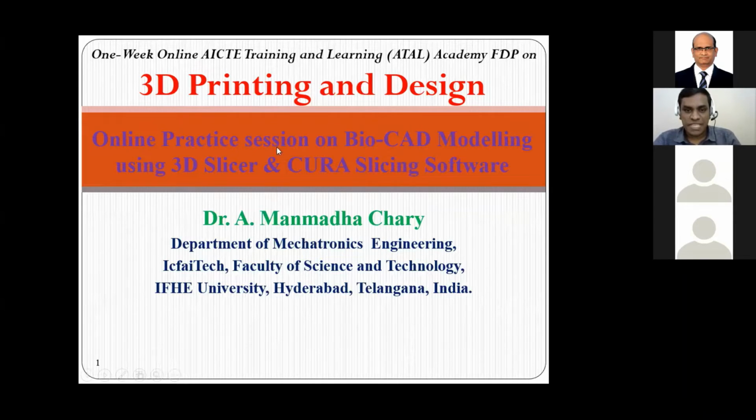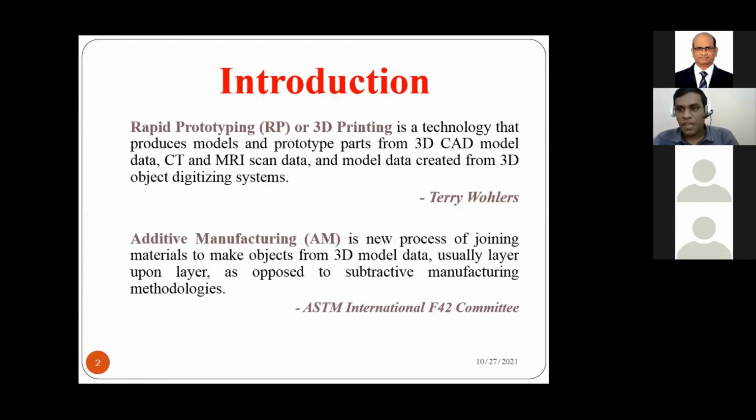With these software, we are going to develop a Bio-CAD model, as well as G-codes or whatever slicing models are required. That slicing we are going to do using the CURA software. Already you know rapid prototyping, 3D printing, additive manufacturing and solid freeform fabrication. They all are synonyms.